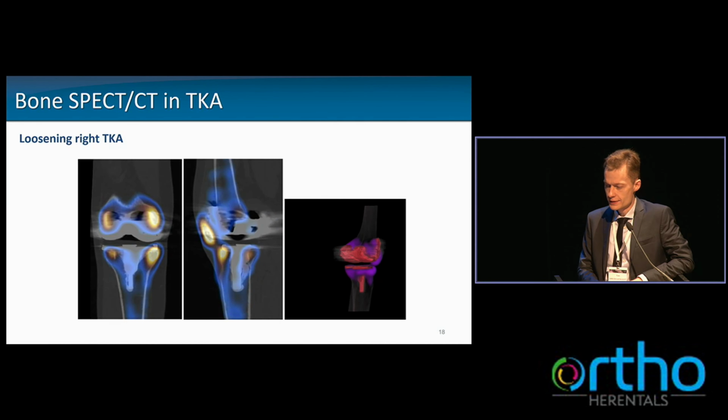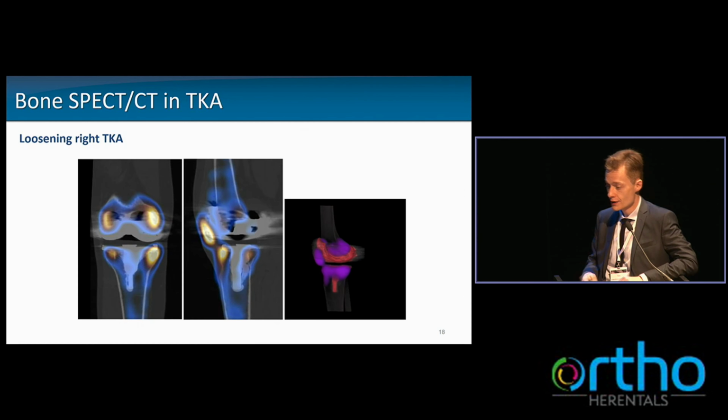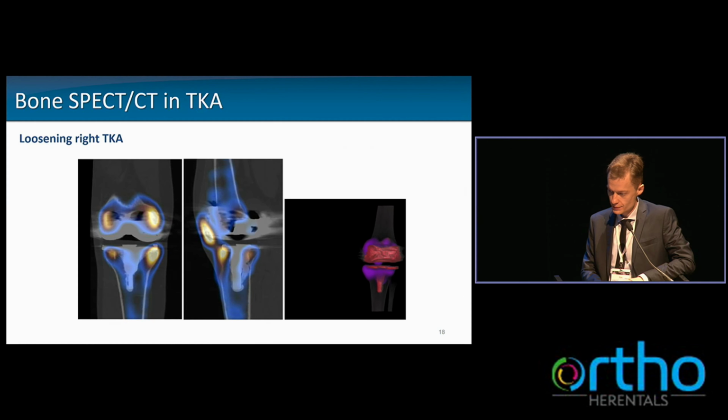Just some samples to give you an idea of the images that we create. So obviously this is too much uptake on these sides here, there, and there. So yes, this would be a loosened prosthesis.